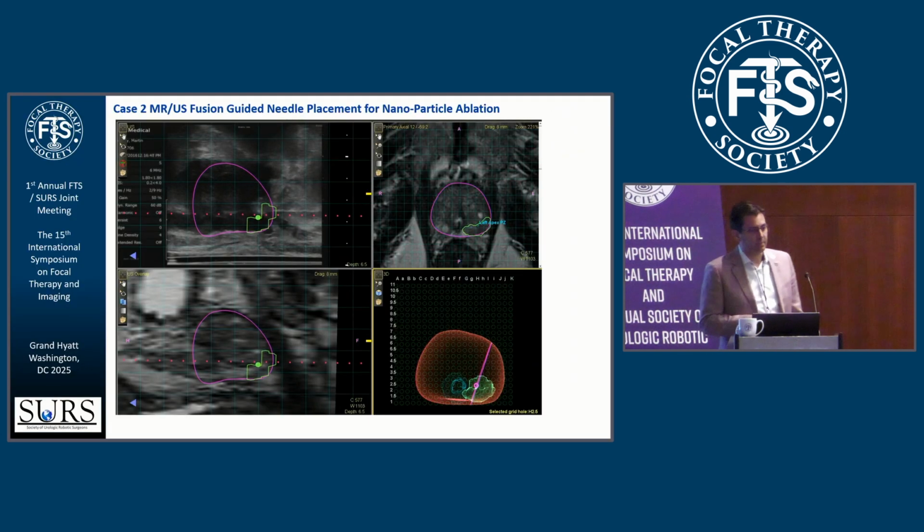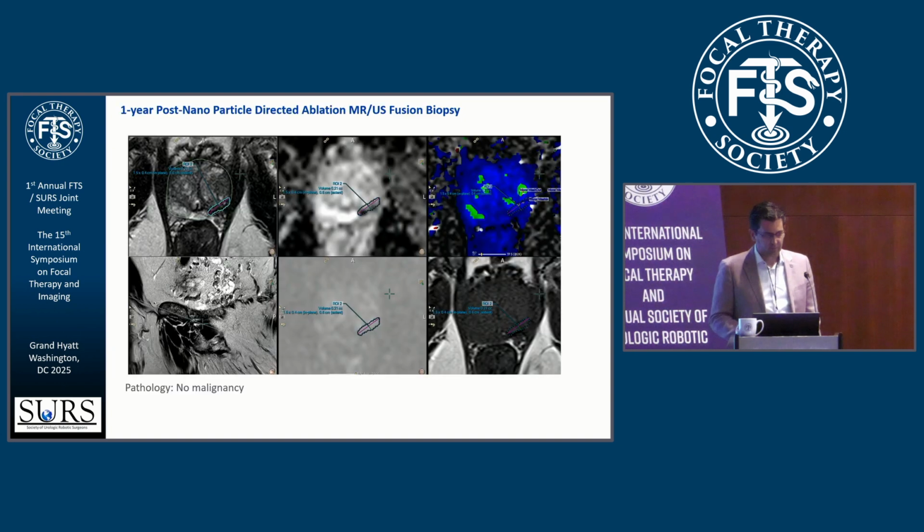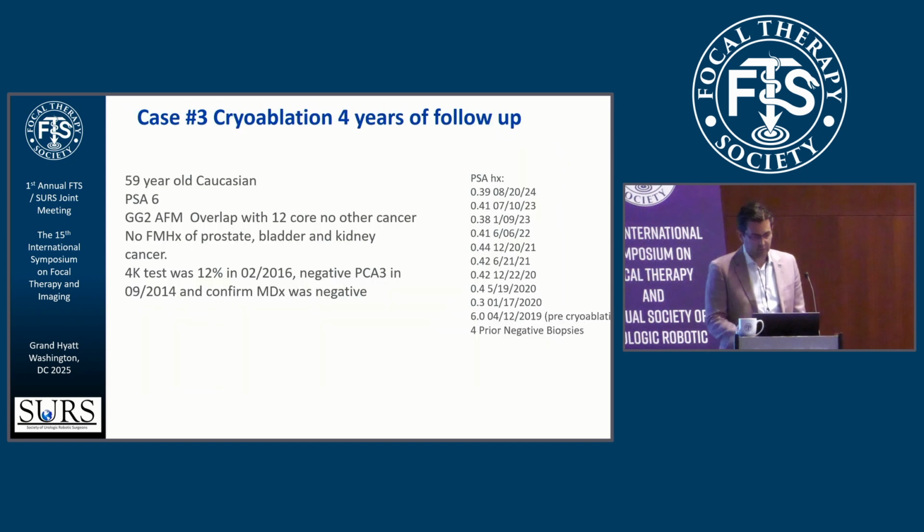This is an example of nanoparticle ablation from one of our earlier trials. After the case, you can see clearly here you have enhancement and lack of enhancement in the proposed treated zone. Interestingly, the urethra was untouched and the ablation is very close to it. It's based on the nanoparticles absorbing the energy. Same thing, we're just following up the scar tissue, completely ablated.